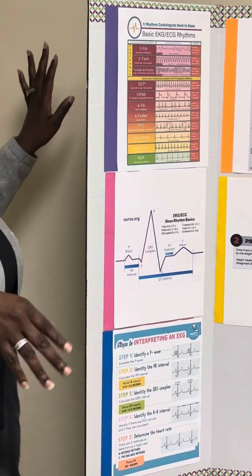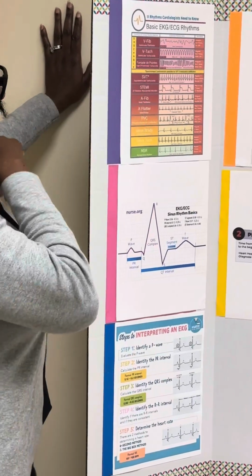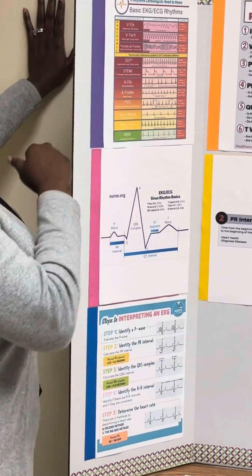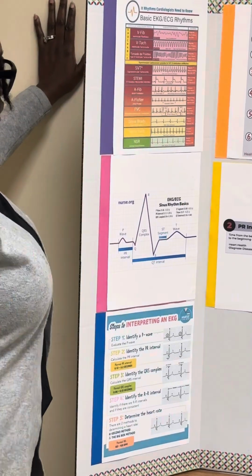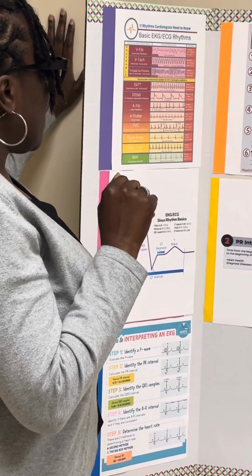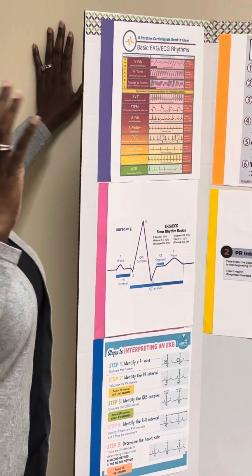We just had the OLM with cardiac rhythms, and some of this kind of coincides with it. I'm going with that green light, yellow light, red light rhythm. Our sinus rhythms are going to be green, everything is okay. Our yellow is going to be some of our occasional PVCs, and then our atrial rhythms. And that's going to be caution.